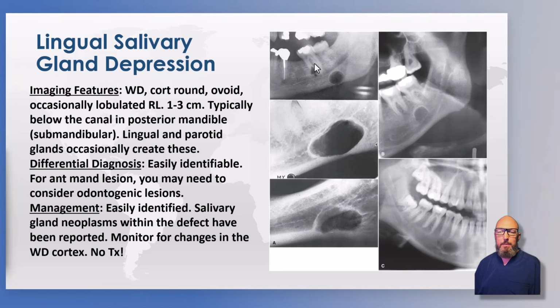Most of the things we've talked about in this course are odontogenic. This is the one thing, and fibrous dysplasia, but this looks nothing like fibrous dysplasia, but this is the one thing so far we've talked about below the canal. I guess dense bone islands, those can occur anywhere. What else is non-odontogenic? Traumatic bone cyst, that's one that could occur anywhere, although it typically does occur more in the odontogenic region. And then also focal osteoporotic bone marrow defect is another, a lot of times non-odontogenic one, but one of the common findings for those is an extraction site that just didn't heal in. And so that can have a tendency toward odontogenic too. And so this is the one we talked about below the canal.